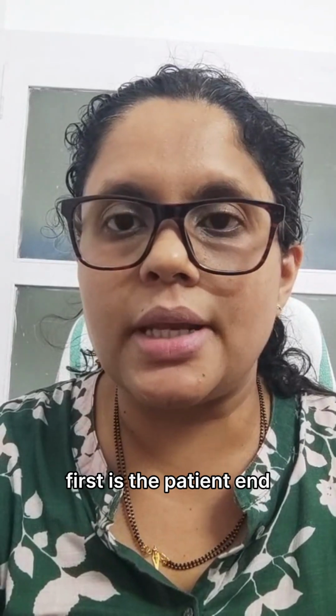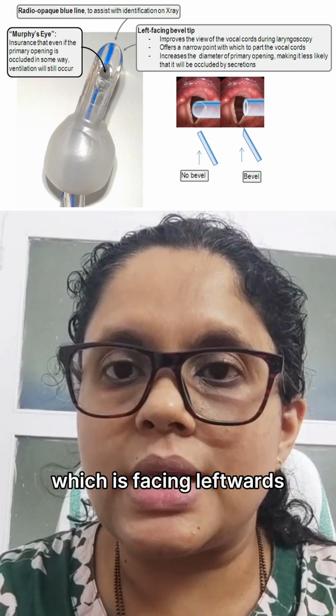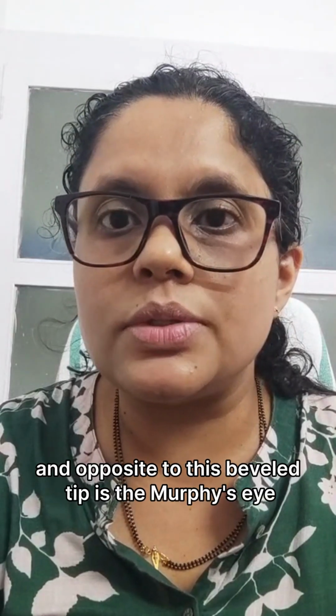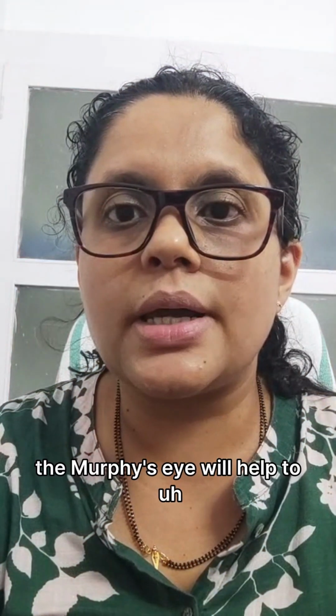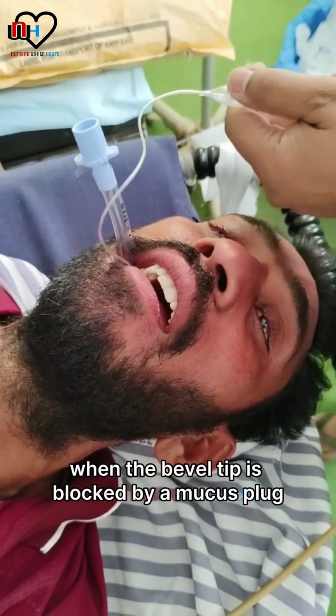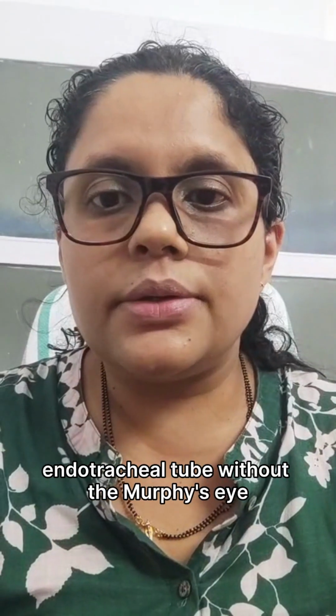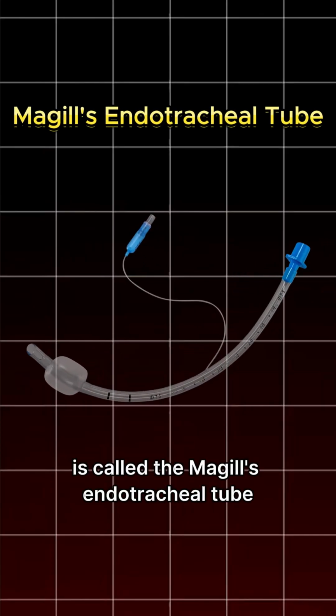First is the patient end. The patient end is a beveled tip which is facing leftwards, and opposite to this beveled tip is the Murphy's eye. The Murphy's eye helps to aid ventilation when the beveled tip is blocked by a mucus plug. An endotracheal tube without the Murphy's eye is called the Magill's endotracheal tube.